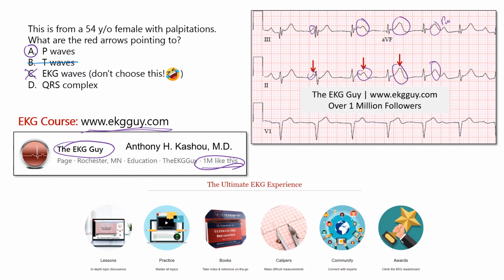Here's a P wave. Okay, here's your P wave down here. T wave, it's your normal one in AVF, and this is your normal one in lead 2. This is your P wave and P wave. So hopefully that makes sense.